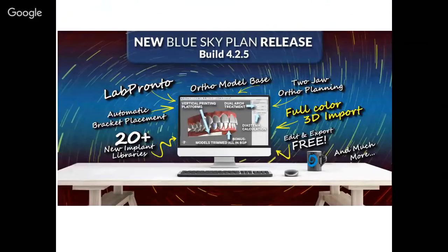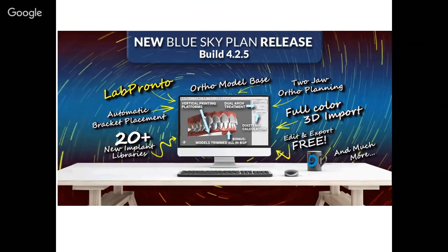Since the last webinar presentation, we have the great news of a new software release. This is software build 425. And you can see on the screen a lot of the new features and functionality that's in the software. The ortho module is fully integrated, and we have a lot of new features and functionality in the ortho module, which we're not going to discuss in this presentation, but we will be discussing in future presentations.